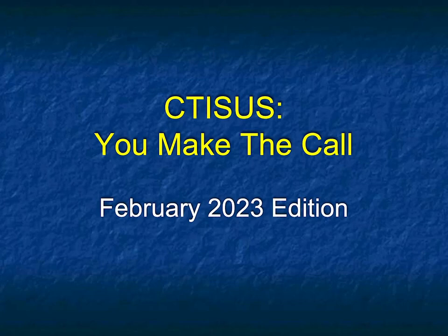You may remember it's a very simple game. I'll show you two images, one slide, and I need you to give me the best diagnosis possible. I'm not going to give you a set of choices, but we'll simply discuss the case. So without any further ado, let's get started.